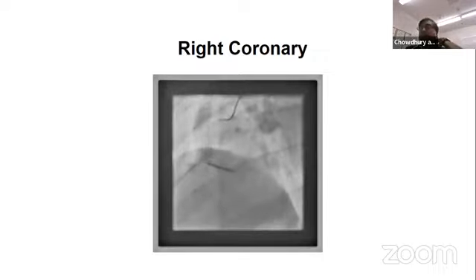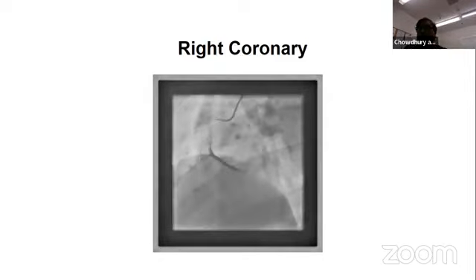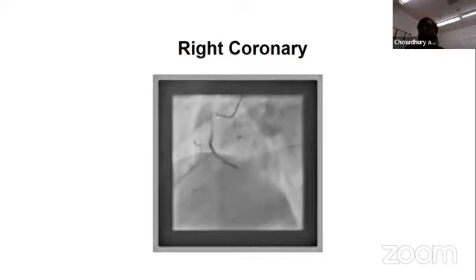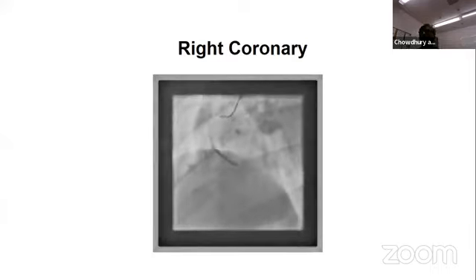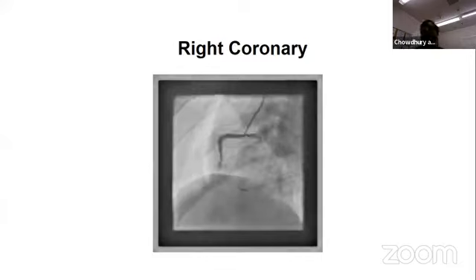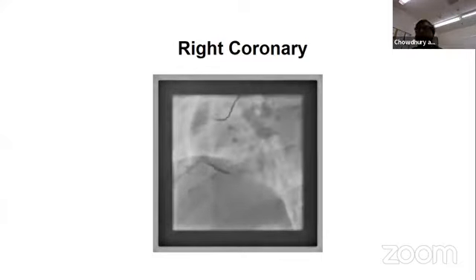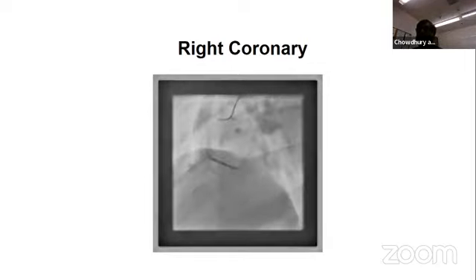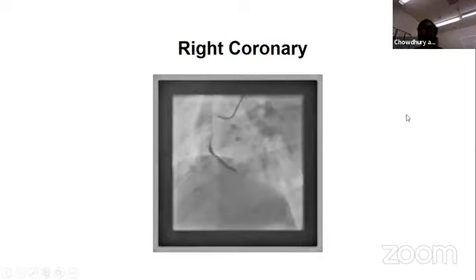And it did not fly that well. So, if you can see that if something is in the LAD, EKG is probably the most sensitive in terms of EKG interpretation. But the circumflex and RCA, dominant left circ, you may not see it. ST 2-3 AVF, which one is bigger, and associated lead 1 and AVL, it did not pan out. Neither that sensitive nor specific.